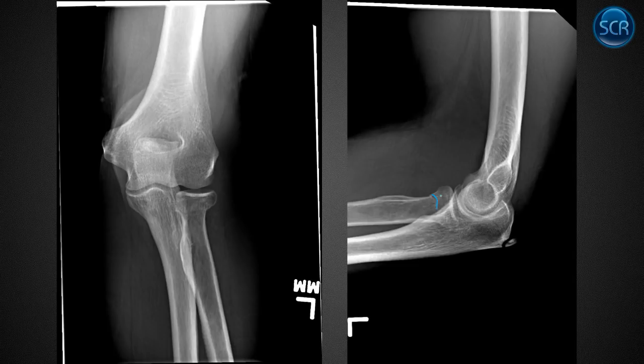All right. So they have a radial neck fracture. You see, they don't really have a joint effusion here. The anterior fat pad isn't too elevated. We don't see the posterior one. So it's probably subacute. They do have a fractured olecranon enthesophyte, triceps insertion, right? Getting a little enthesophyte here. It looks like that thing's fractured. If we could window level this maybe a little bit, if we weren't in PowerPoint, we might see some olecranon bursitis overlying.